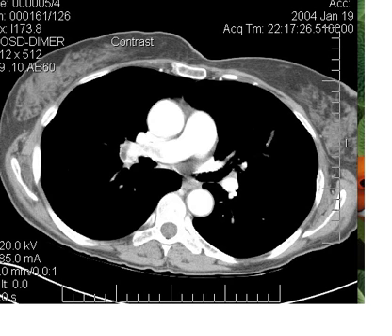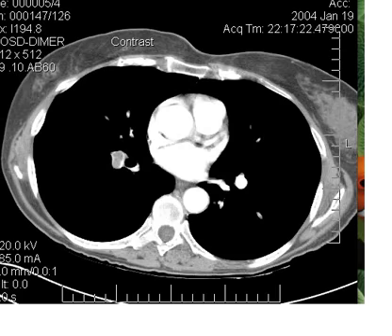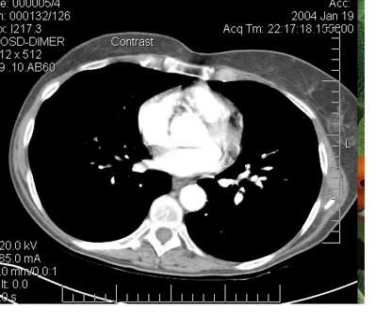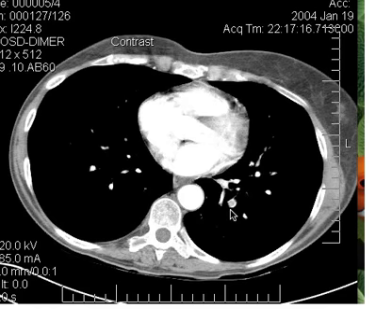Okay, so here you have the left main pulmonary artery, and even though we don't have a big clot in it, if we follow the left main pulmonary artery into the left lower lobe pulmonary artery here, we see that when we get to a branch point, a little bit lower here, right at that branch point, right where this thing's coming off, we see that filling defect. And here it is here. So that alone would be enough to call this a positive PE study.